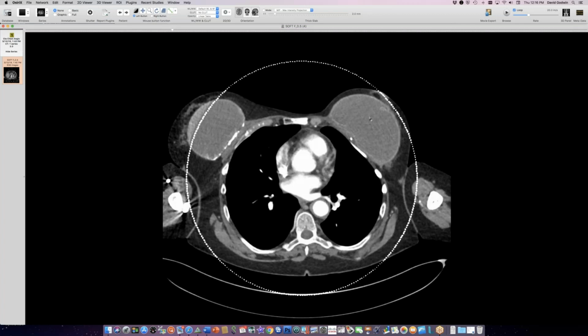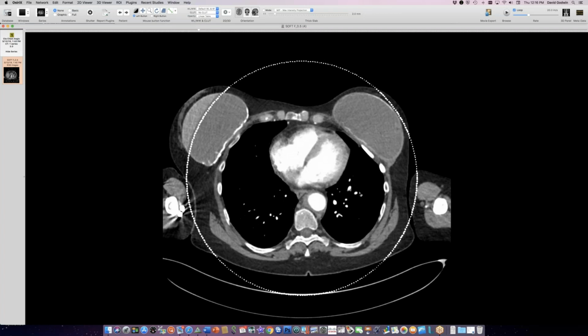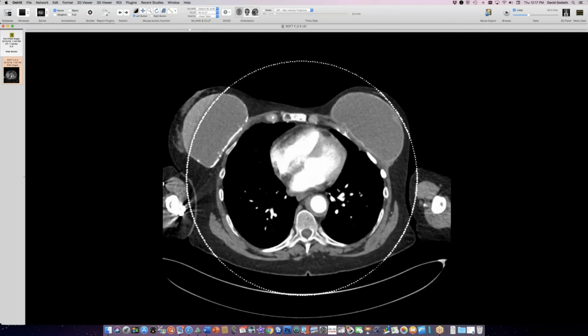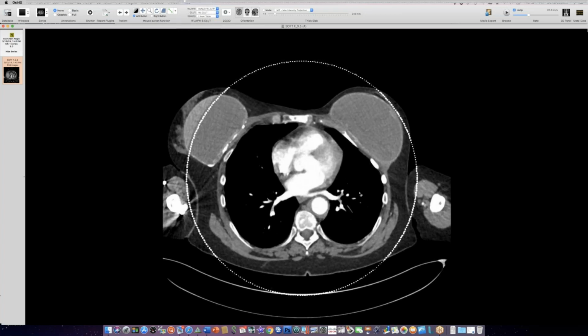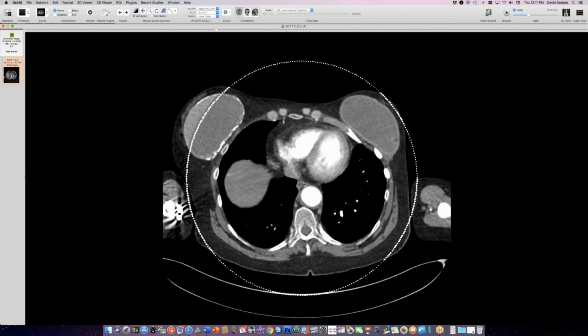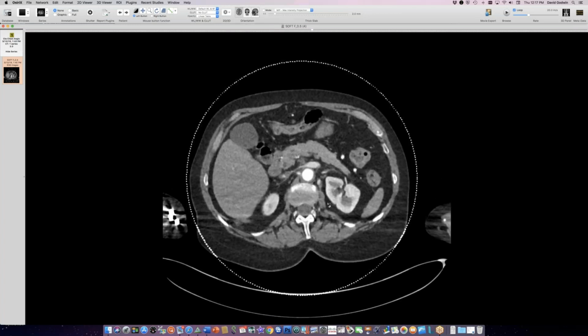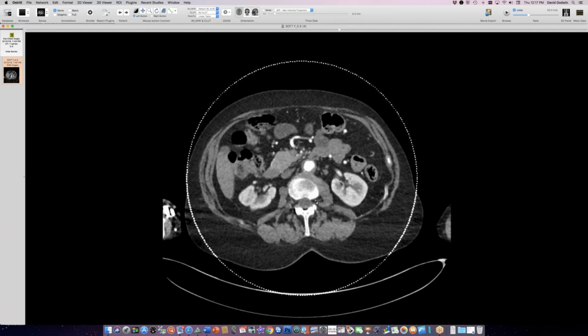She did have these breast replacements. She did have a carcinoma. I don't know if it was both sides or one side, and they did the other prophylactically or something like that. But there's a history of breast cancer. And then this aortic abnormality continues down through the abdomen with wall thickening and some degree of dilation.